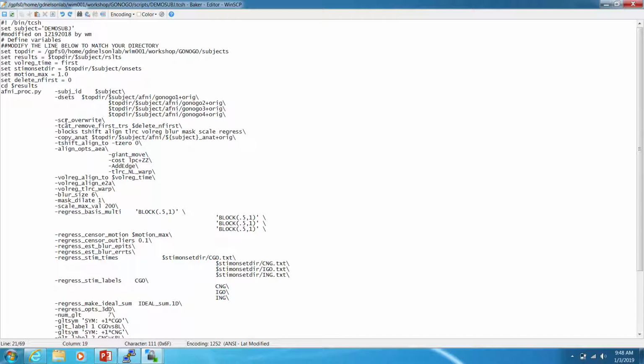Typically in the past, in neuroimaging, the first few volumes that we get tend to have the brightness contrast of the images kind of a little messed up by just the properties of the scanner. More modern scanners tend to do 4 to 6 scans and then cut them out anyway. It varies by the scanner, but that's why that command's in there. Don't accidentally set this to something when you don't mean to, or everything will be off in your data file.